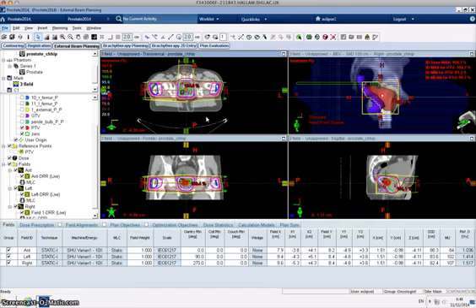So in terms of what weightings do, this is a really nice tool for us to control the dose. Now I've chosen 3 fields for this plan, which is probably not something you would do clinically, but I just wanted to do this so it wasn't the same as what you were doing, so you have to think a little bit about what's going on. I've only got 3 fields to think about, and I've popped on some extra isodoses now so that we can see the full spectrum of dose distribution.